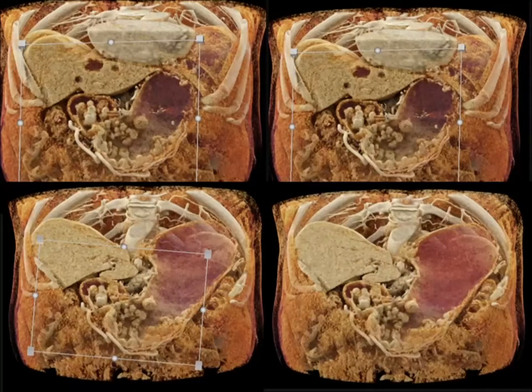Or in this case, look at all of those polypoid lesions in the gastric antrum and body. This was biopsied, this was carcinoma. Not every polyp, but this was an adenocarcinoma arising within gastric polyps. What a beautiful example showing you the lighting model of the polyps, the interface to the stomach.